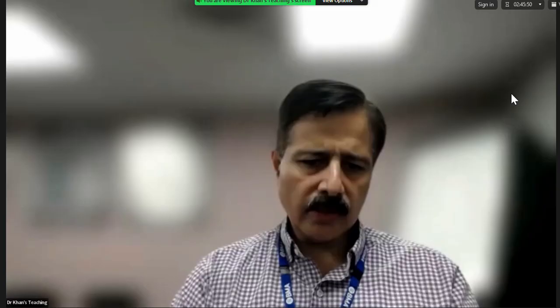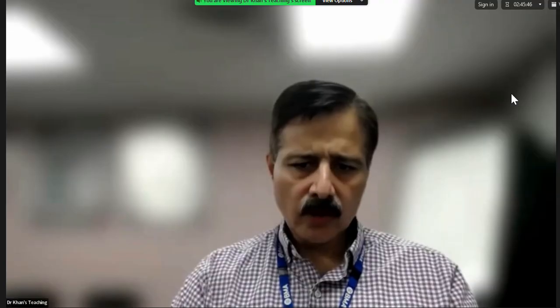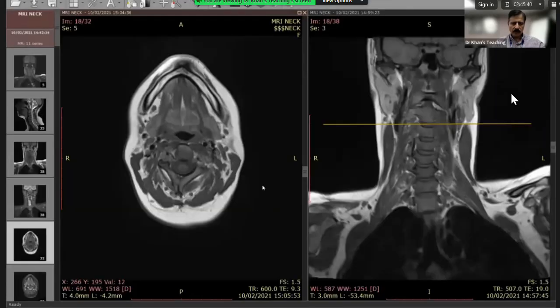So let's go through in a DICOM format. Now, candidate 1, can you see my DICOM viewer?